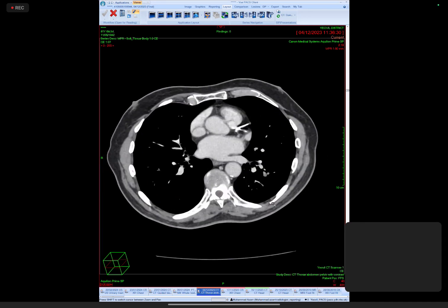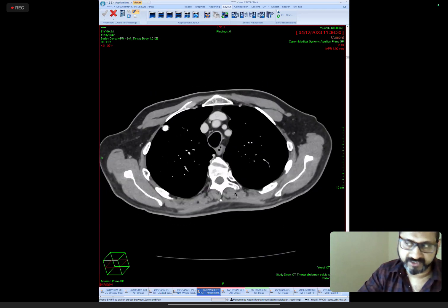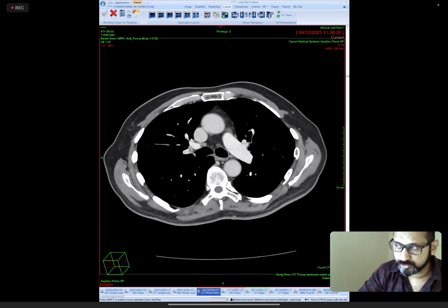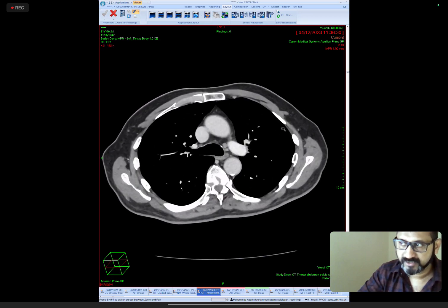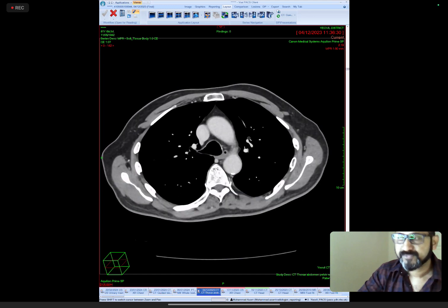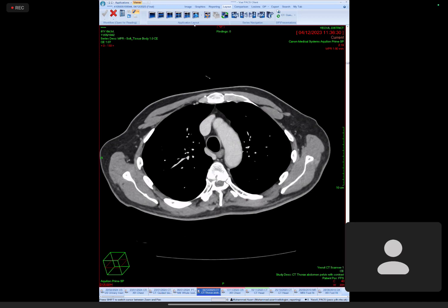Once you found the neoplastic lesion, you would say for staging the lymph nodes, other lobe involvement or other lung involvement would go to M1. If you don't see any hilar lymph nodes, then mediastinal is very unlikely if there is no hilar. So staging will be changed. This is contralateral mediastinum. So it is a neoplastic lesion, and that was a deceiving calcified granuloma. Is that okay? Yes, sir.